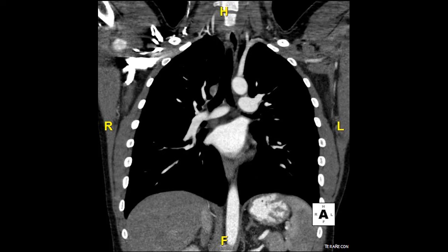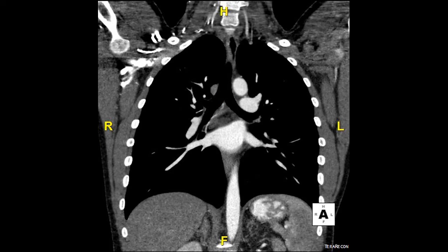Here, I want to point out some structures I mentioned earlier in the presentation, the trachea and the primary bronchi. Now they show up black due to the air inside of them, which makes them a little hard to see on this image, but I'll go ahead and outline them for you right now in this light blue color. That'll make it a little bit easier to see the boundaries. You can see the primary bronchi branch further into the lungs, so with the same color, I'm just going to outline a little more.